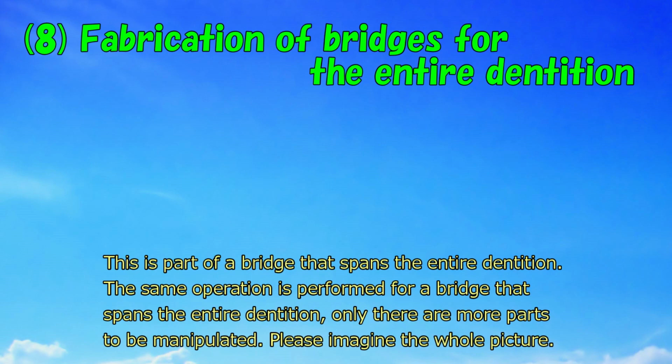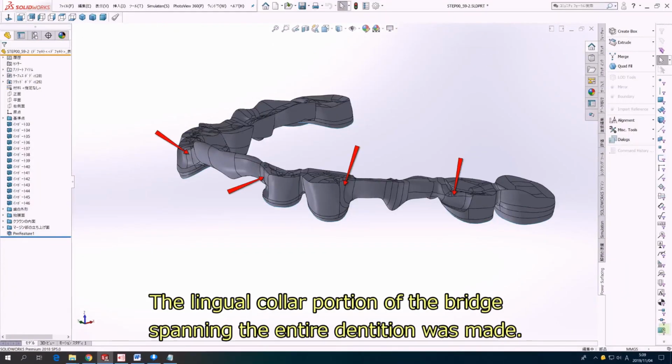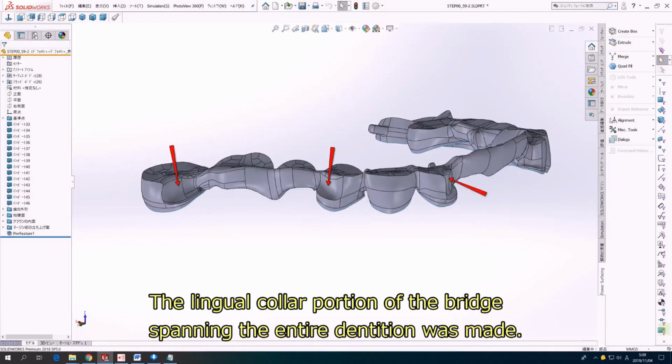This is part of a bridge that spans the entire dentition. The same operation is performed for a bridge that spans the entire dentition, only there are more parts to be manipulated. Please imagine the whole picture. The lingual collar portion of the bridge spanning the entire dentition was made.